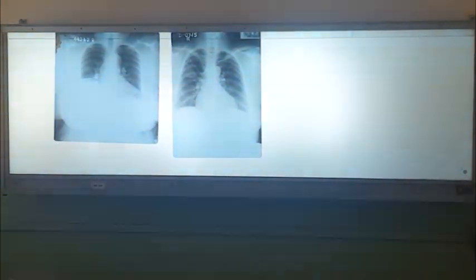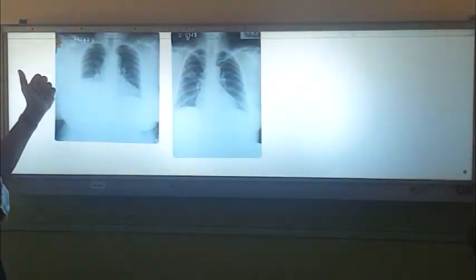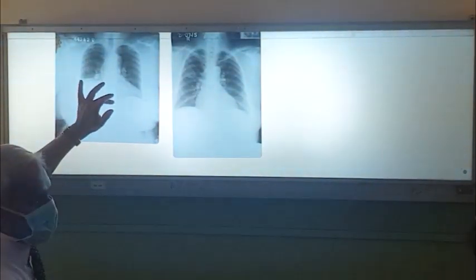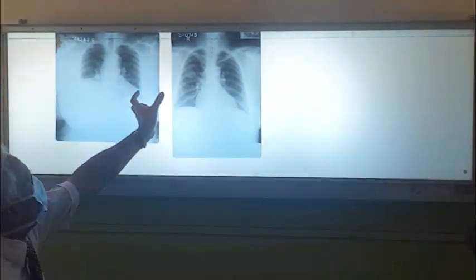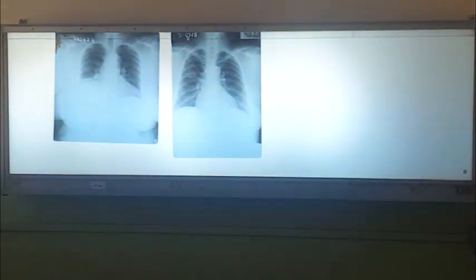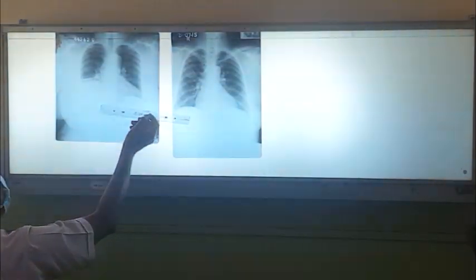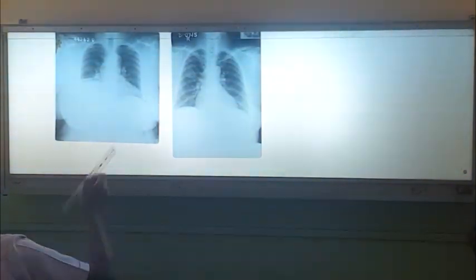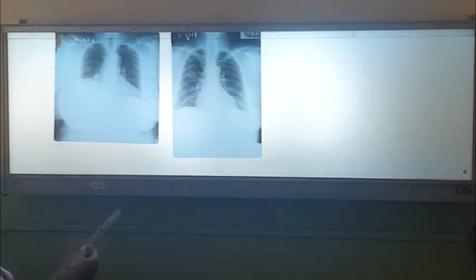Basically, I have most of the lung pathologies, so go and read everything, right? If you look at this one, it's a well-centered film, but you can't see the intervertebral disc, so it is underexposed. And you can see this thick chest wall, so it must be an obese female patient. And then look at this diaphragm. The left hemidiaphragm you can see nicely. Although this looks odd, you can see a lot of things here, right? Poor quality X-ray, but you can see them.